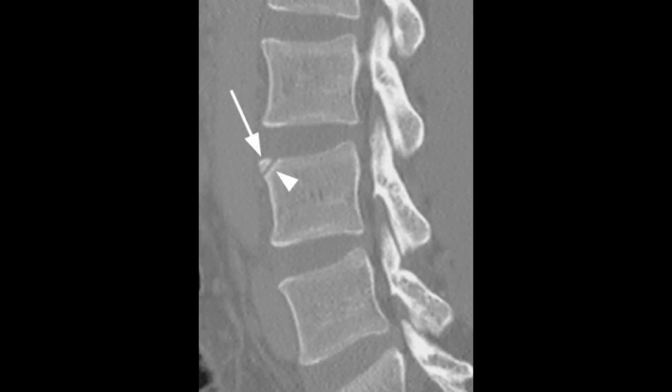Limbus vertebra is an intraosseous herniation of disc material at the junction of the vertebral body rim and the central end plate, at the anterior superior corner. It is very beautifully shown here. It looks like there is some fracture, but this is not a fracture; it is actually intraosseous herniation of the disc material.